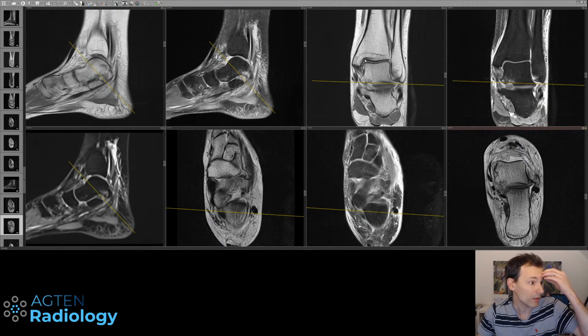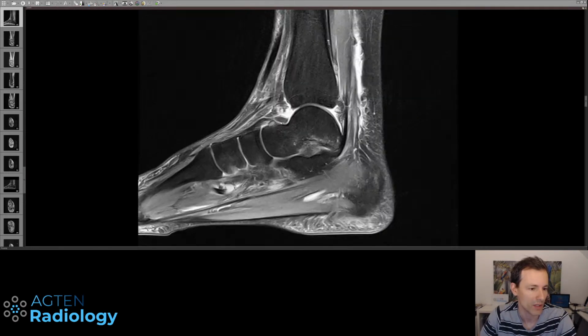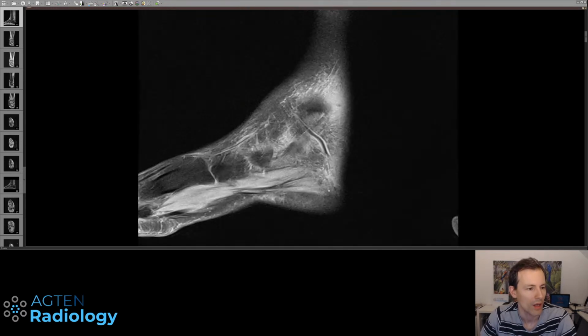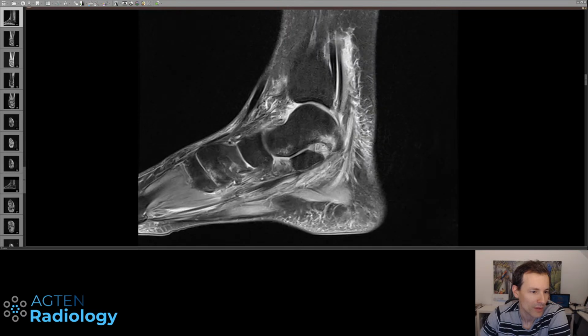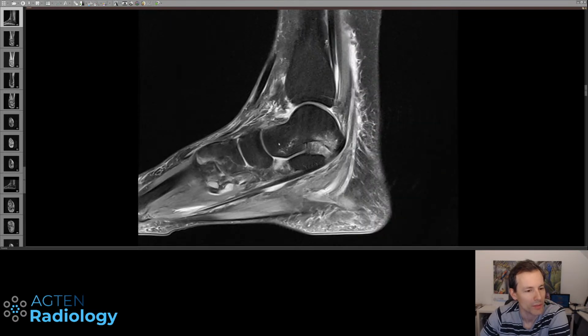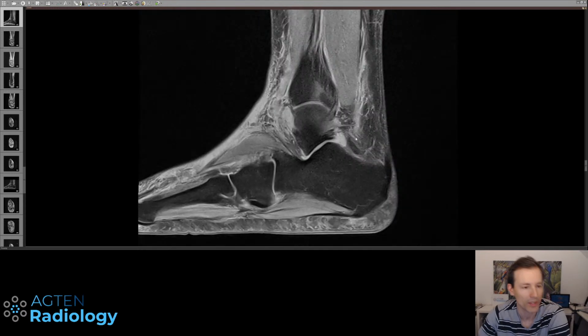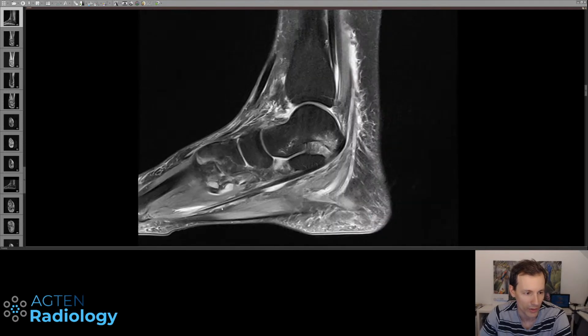Yeah, so basically let's start with the STIR, or with this PD fat sat sequence. It's always a good way to start this kind of analysis. Yeah, and I have 2 viewers now, that's crazy. Okay, so anyways, when you scroll through the sagittal PD, you immediately see bone marrow edema lesions, you see all this soft tissue edema, and this already gives you some kind of indication how acute the trauma is or how severe the injuries are going to be.